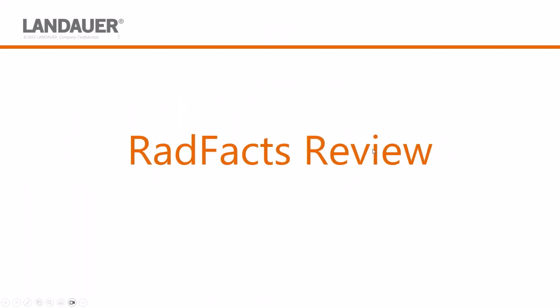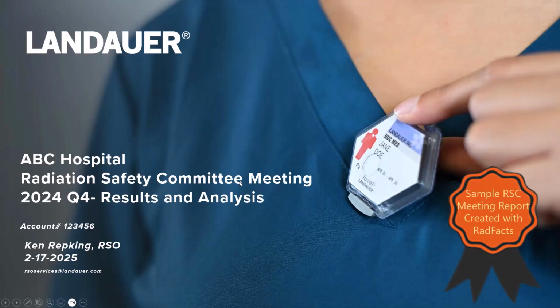Okay, so what we're going to do now, within RadFacts, I work for the Radiation Safety Support Services side, and we create RSC presentations. So we're actually going to see what a presentation looks like, and there'll be a few extra screens to show the changes that we have made. So we're kind of double dipping here.